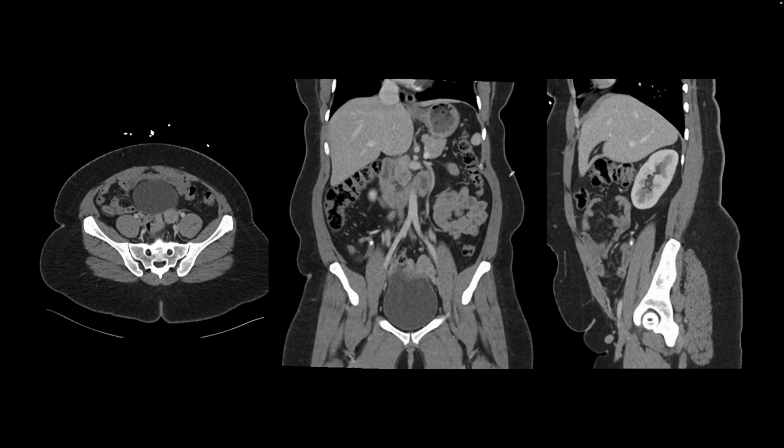This is our next patient, and here they presented with right lower quadrant abdominal pain. We see appendix right there, which is distended. There is some minimal fat stranding around it. The findings are not very well seen on the axial image, but on the coronal image, we find an appendicolith. Distal to that, the appendix is dilated and distended. We see that finding right here, right? Appendicolith, and the appendix distal to that is distended and dilated. And so this patient has acute appendicitis.